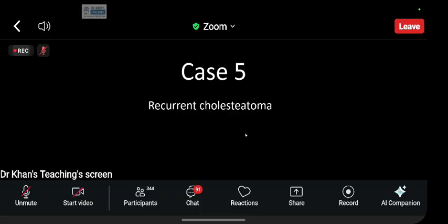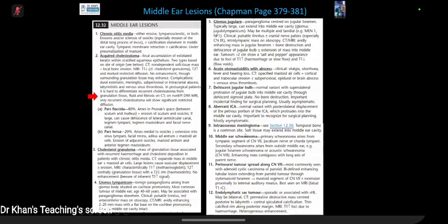So this was a recurrent cholesteatoma. Basically, what happens is, in post-surgical cases, as I'm reading from the book, it is hard to differentiate recurrent from granulation tissue, fluid and fibrosis on CT. So we do DWI. This is what we call non-EPI, non-echoplanar imaging DWI sequences, because otherwise there will be a lot of artifacts. And please remember that cholesteatoma by definition is epidermoid. Epidermoid and cholesteatoma is the same thing.